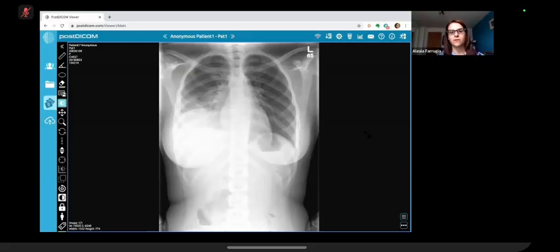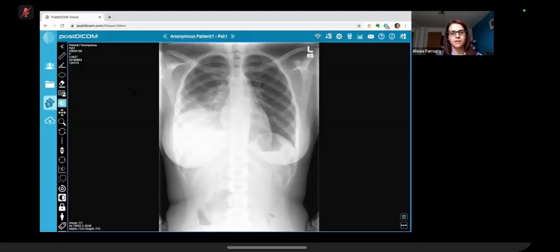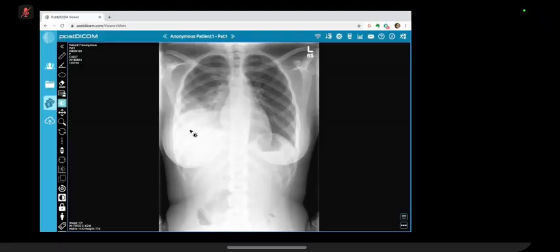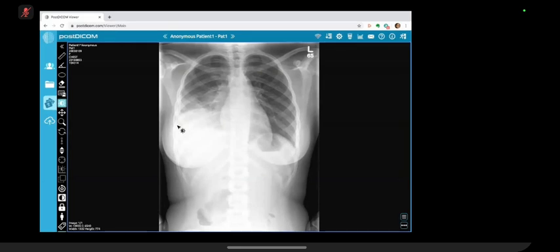Okay, so this is right lower consolidation, mostly pneumonia given the history. I'd like to correlate with the inflammatory markers and the clinical picture, as you said. A lateral X-ray would help localize the pathology. An ultrasound also would assess for associated pleural effusion.